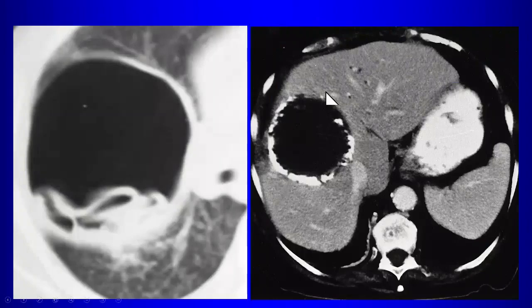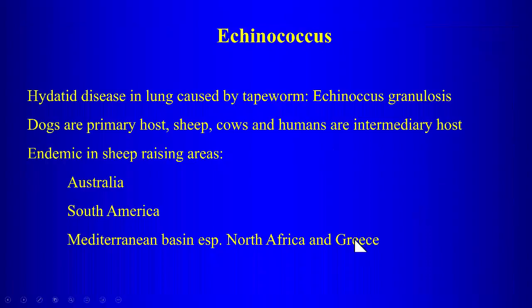In the liver, these things calcify. They don't calcify in the lungs, right? So this is an echinococcal infection within the lungs. So this is called the floating lily sign. When this thing ruptures, then the contents of it kind of float within this layer of fluid, within this ruptured echinococcal cyst. So it's kind of a pathognomonic appearance of a ruptured echinococcal cyst.